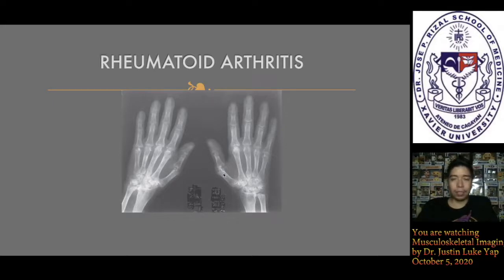Soft tissue swelling in this case is not so evident. You also have erosive changes here. Again, it's more or less symmetric. You also have some erosive changes here in the first metacarpophalangeal joint.